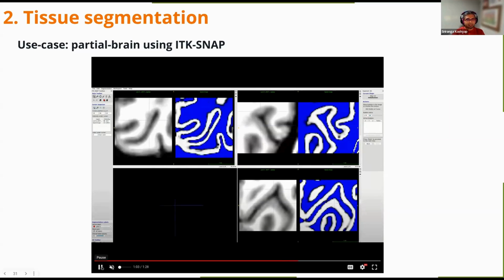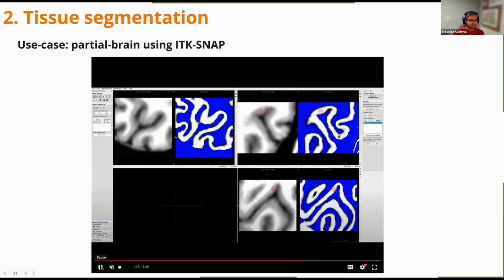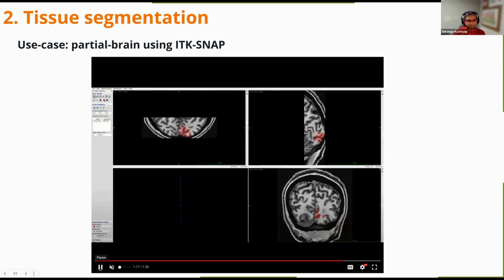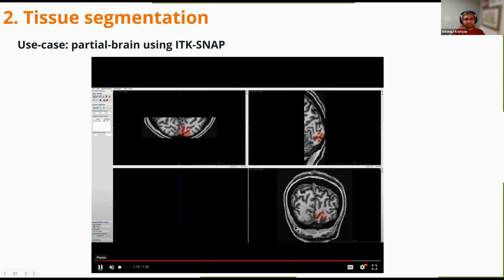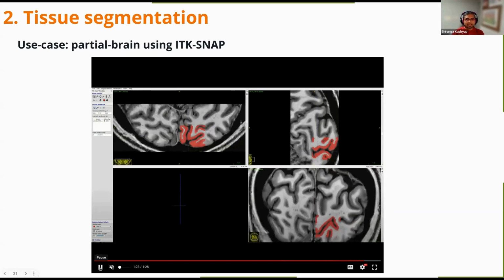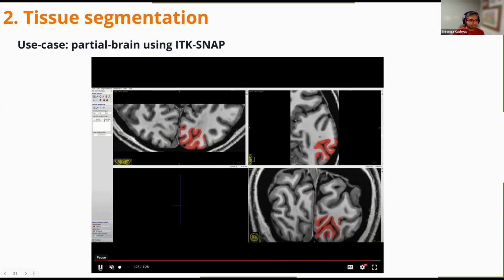This time I'm making the bubble smaller because it's a very thin strip that I want. And you let it flow. And once it flows through, now you have your gray matter beautifully, more or less segmented. If you're doing laminar fMRI, you would again pay more close attention, clean this up, tweak things manually, but it's a great starting point, which is automated.